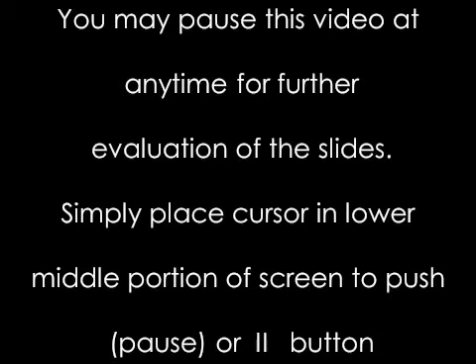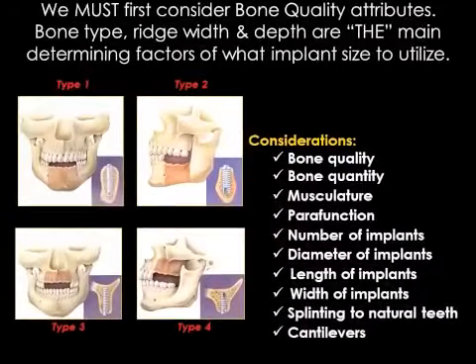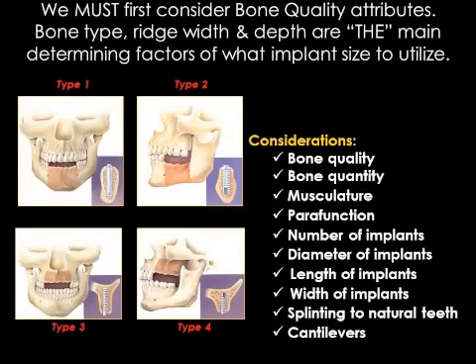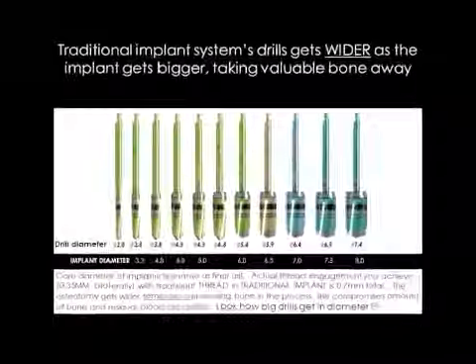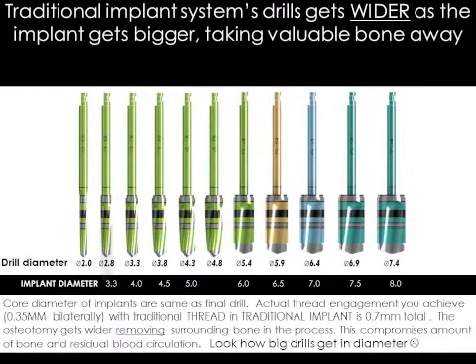One of the things I'd like to point out is this implant system is truly taking bone biology into account. So what does that mean? We're dealing with your different types of bone. In other words, your type 1, type 2, type 3, and type 4 bone. The anterior mandible is type 1, posterior mandible is type 2, anterior maxilla is type 3, and posterior maxilla is type 4. And you can see the different densities involved. With the AnyRidge system, you're going to note the different types of thread patterns that we utilize to get increased primary stability in the different thread patterns themselves.